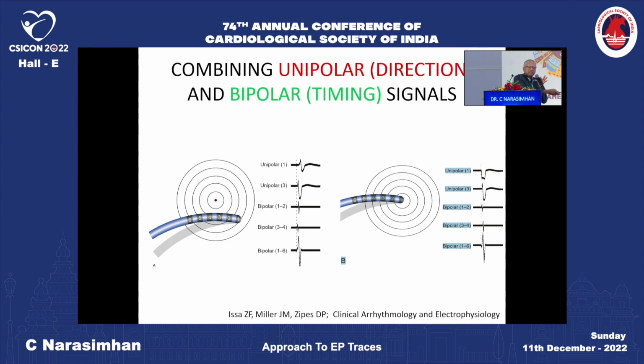Now in modern day electrophysiology, we don't need to do all these things. The computer does it for you. In the olden days, we used to remember that this is where it was and keep moving. Whereas now the 3D geometry is created by a 3D mapping system.